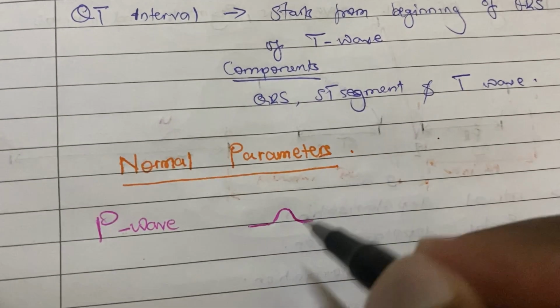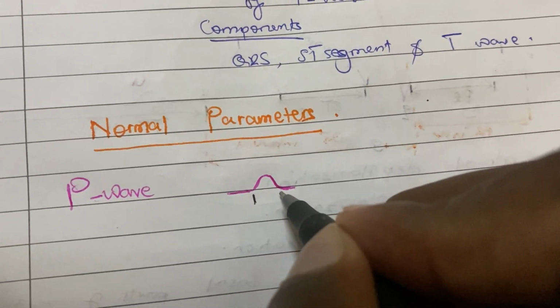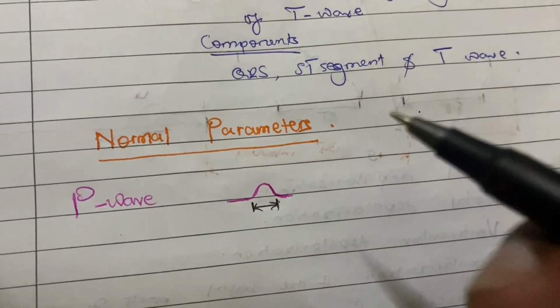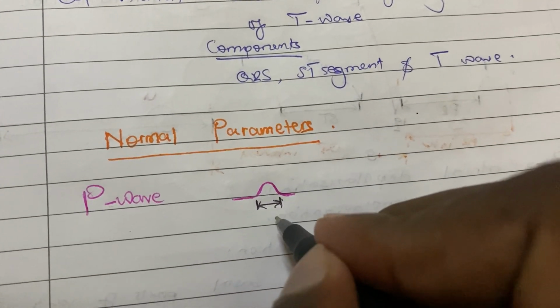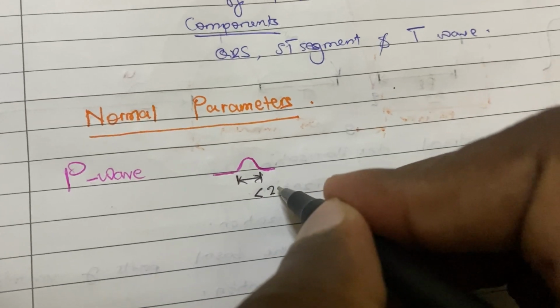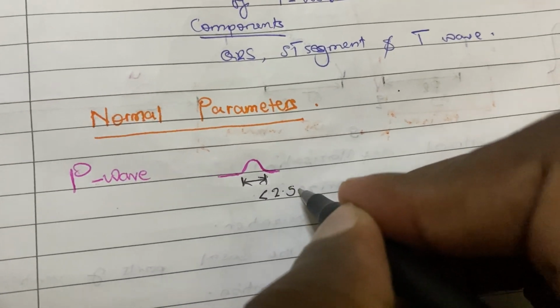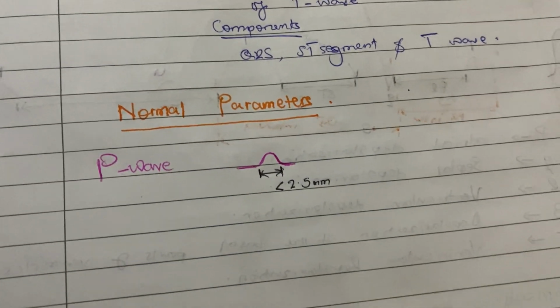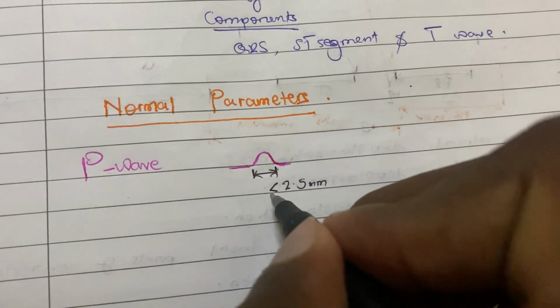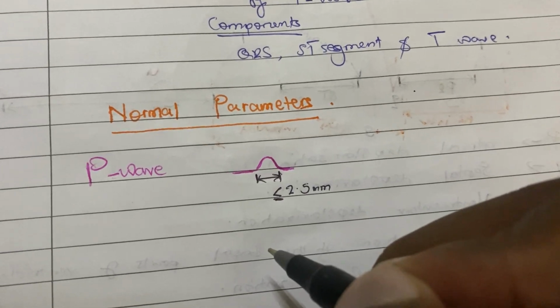And if you were to go from the start to the end, it has to be less than or equal to 2.5 millimeters.